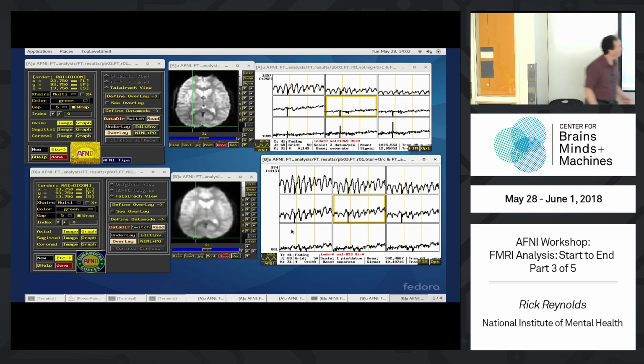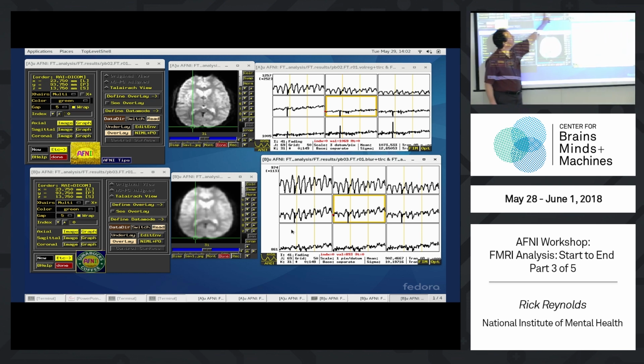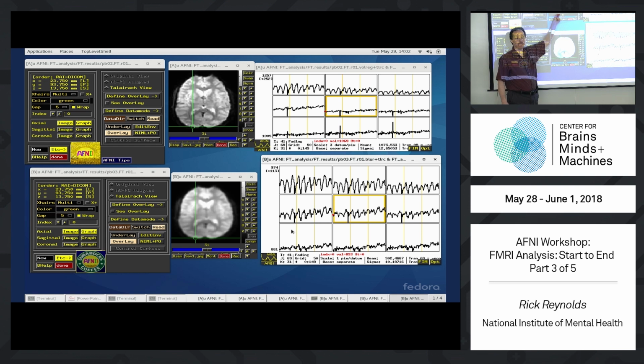This is just one plane. This 3x3 box is 9 voxels here. So in 3 dimensions, you've got a bigger box. You're talking about 27 voxels, including first neighbors and edges and corners. So a central voxel plus 26 neighbors, so that will be the effect in the blurring step.